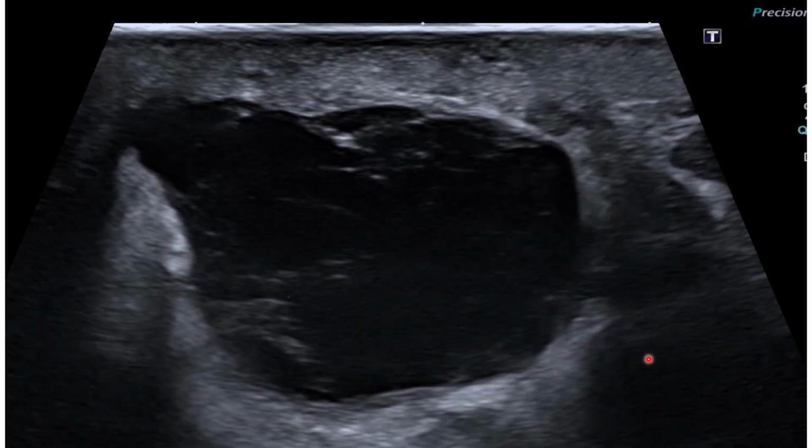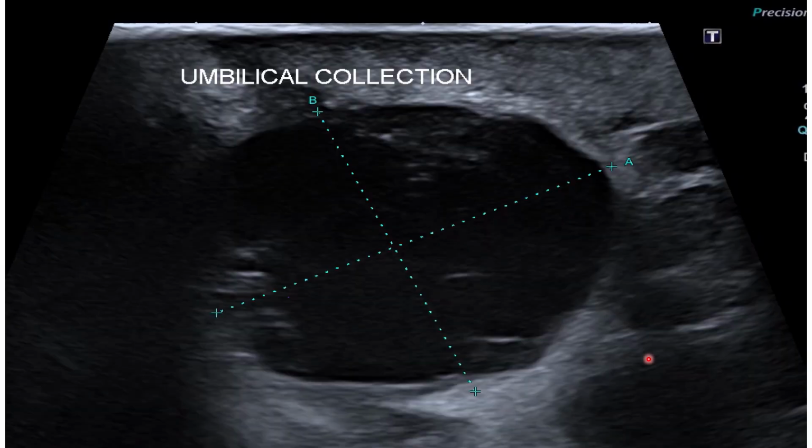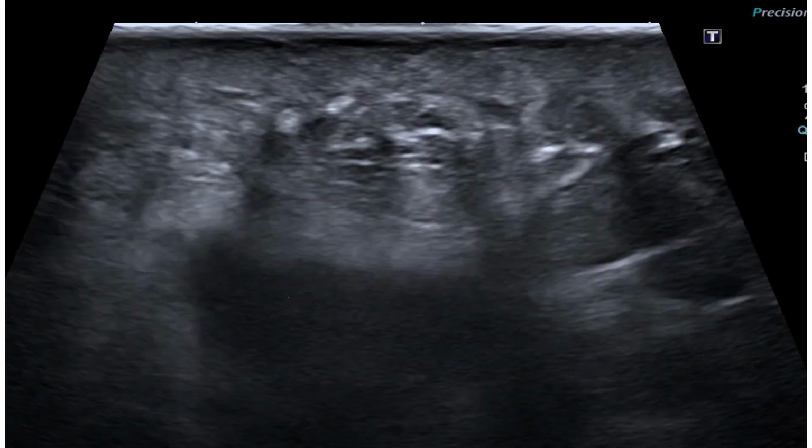But there are some small blood vessels that can also leak or bleed. In this case, because the hematoma is well contained, well encapsulated, it's not a major vessel that has been severed or damaged. It's just a small, localized hematoma there.